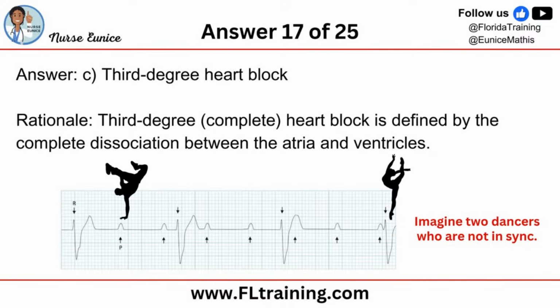So there is no association. The QRS complexes are sometimes before the P waves, nothing's dropping. You all tell me what would be this person's heart rate. Would you be counting the P's or would you be counting the QRSs? And I'll give you about 15 seconds to put this heart rate into the comment area.